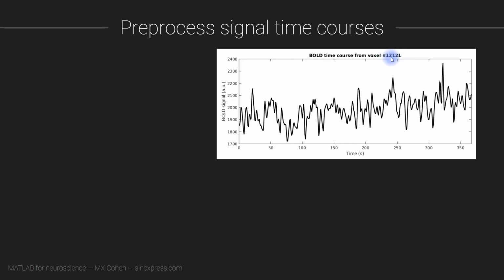But anyway, we're going to apply two different processing steps to the time courses at each individual voxel. First, we want to transform the data into percent change, and second, we're going to detrend the data. Percent change is useful because it's a more easily interpretable metric compared to these arbitrary units here. And secondly, because percent change gets rid of this overall offset in signal intensity value. And these offsets vary over space, which happens in MRI data.